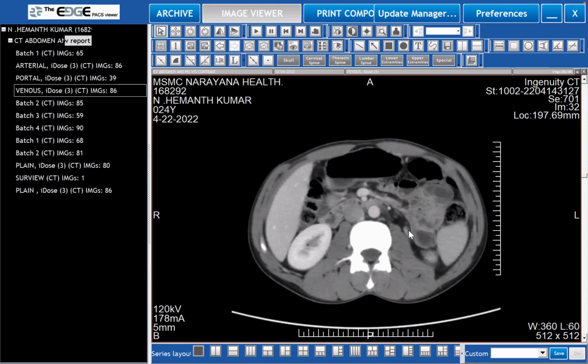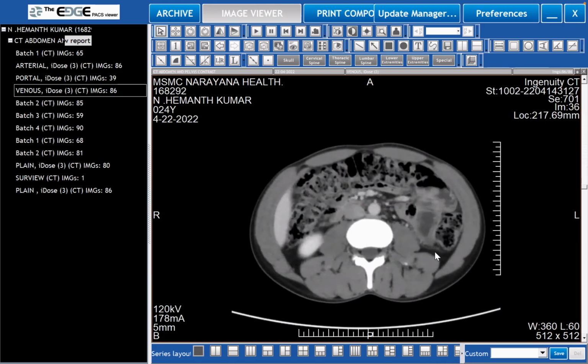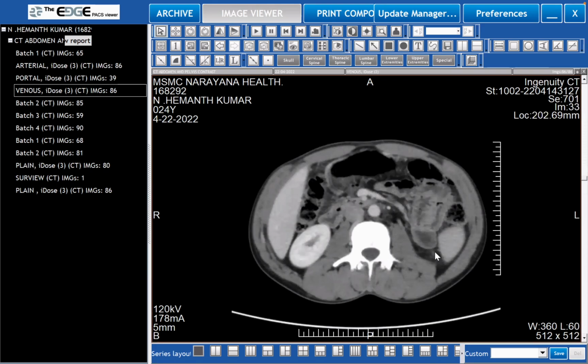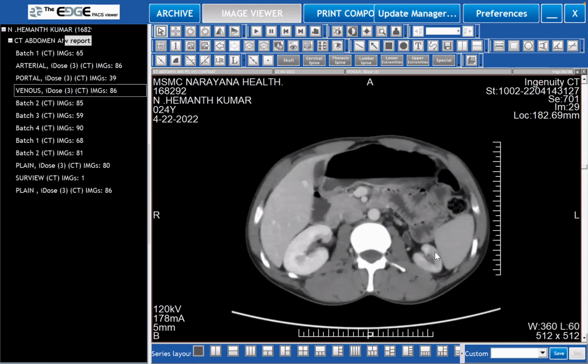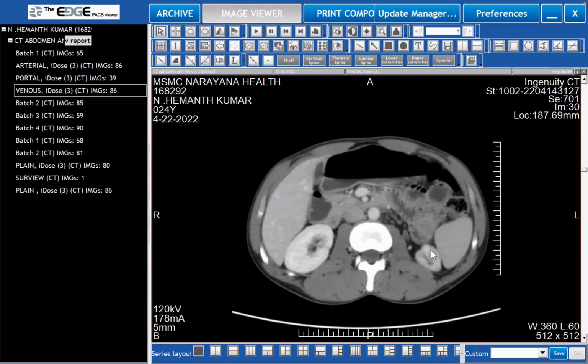And you can see that white stuff slowly withering away. And after that, you'll have to imagine that it exists. So before saying and assuming that it's a dilated extrarenal pelvis, you should have told us about the status of the ureter. Can you comment on this?